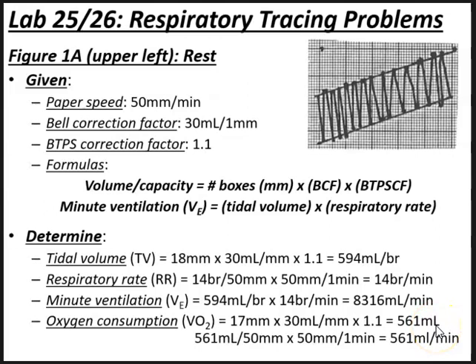Okay, so now we are able to determine all these values from that top tracing, and this is the tracing at rest. Now below that tracing is the tracing after doing exercise, and this is something for you guys to practice just so you're comfortable doing these respiratory tracing problems.